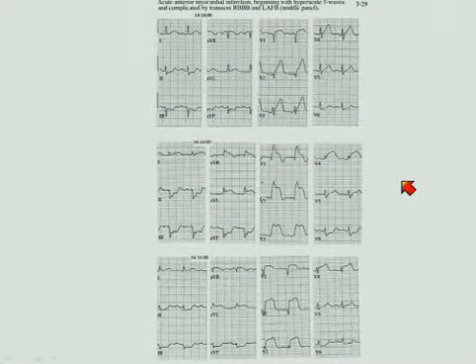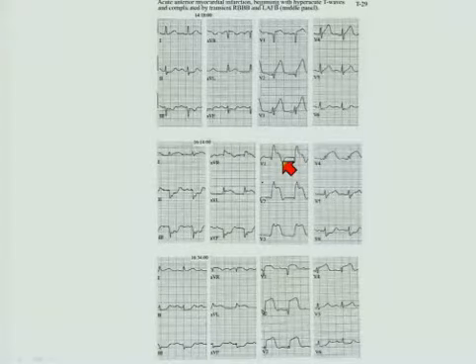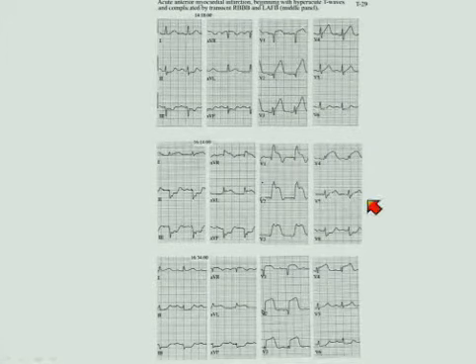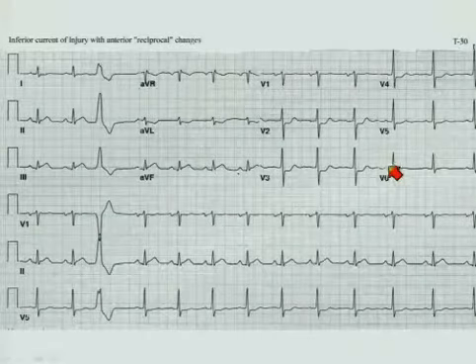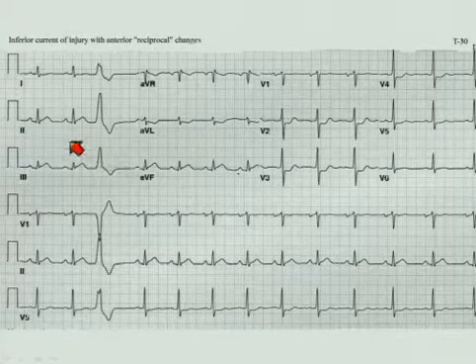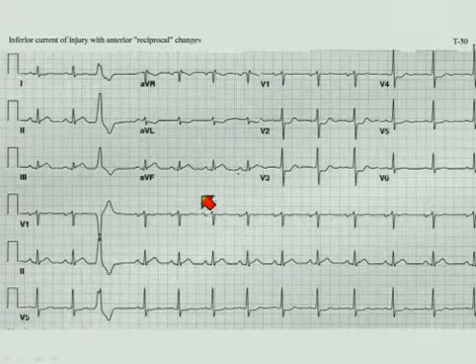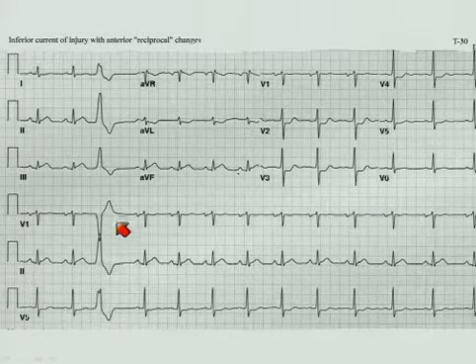Acute ischemic events, ST elevation, often begin with hyperacute T waves, as shown here, and evolve very quickly into the more concave classic ST segment elevation, and then evolution of the changes that you know well into Q waves, in most cases with an ST segment elevation MI, absent an intervention or other change. Here is a patient with an inferior current of injury, not great in magnitude, but clearly evident, and these associated ST segment changes here, also a PVC.